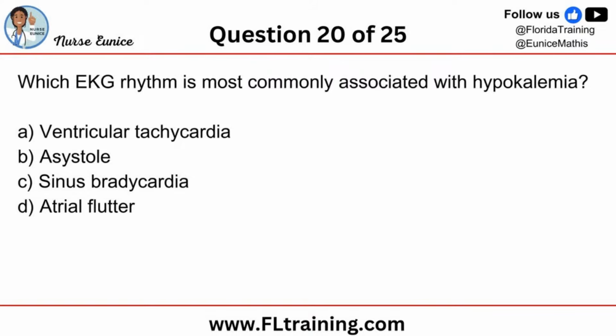Question 20, and I'm so proud of you all for staying on this long. I know this is new content. This is not the fun content. It's not rapid paced. We don't want to rush this. We want you to understand what you're looking at so you can better help your patients.